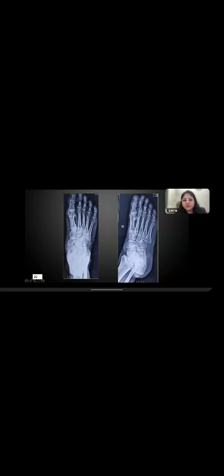Okay, case 22. Both are bone infarcts, both were medullary infarcts. Case 20, 21 are both examples of the same thing. One was femur, one was tibia. Two separate patients. That's why I gave both.